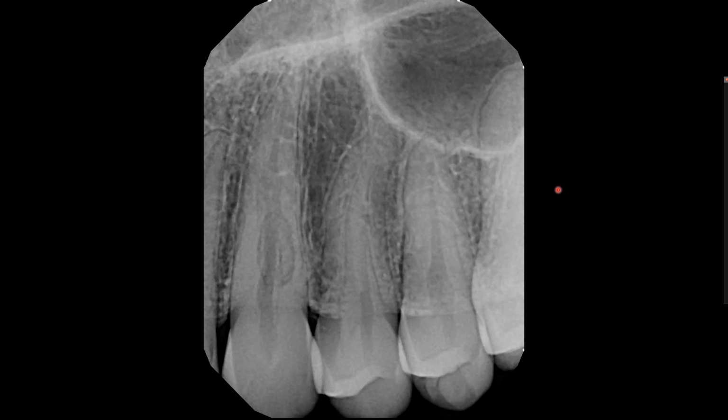From the title of the video, you know that this is root resorption. But that's not it. We still have to figure out if the resorption is internal or external. If external, is it from the labial or the palatal aspect? Since I can see the outline of the pulp canal, it's less likely to be an internal resorption. However, the external resorption may also invade the pulp canal. At least one good thing is that the apical periodontal space is within normal limits.